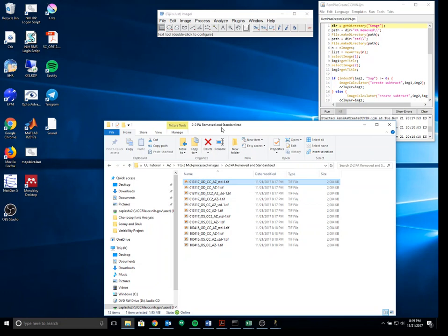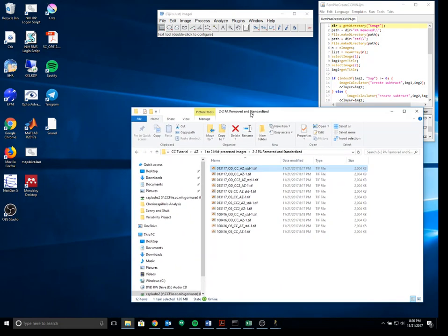And so then, the next thing we have to do is we essentially have to align all of our images and crop them to ensure that they are all looking at the same part of the eye. So you essentially want to make sure that the center is the same center among all the eyes, or among all the images.